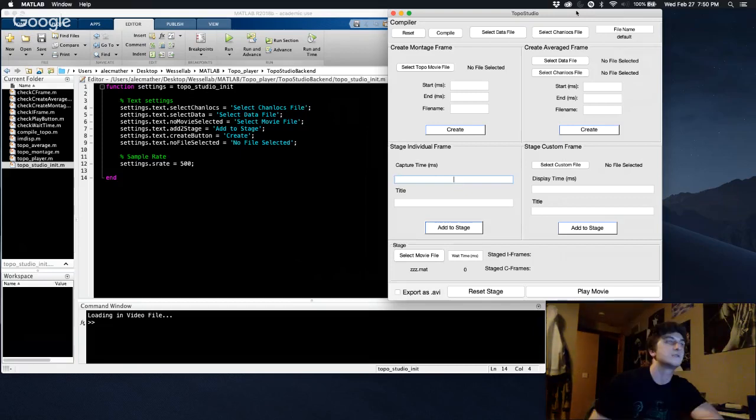So you say, I want the 13th or millisecond 13 between that and millisecond 20. That's not going to work because it's going to go, there is nothing at millisecond 13. So we want to create something that says, but there's one at 13.33333, and we're going to make one from there anyway because we assume that's what you mean.